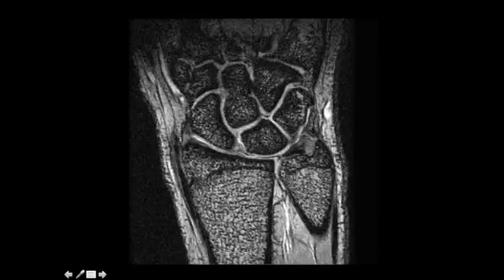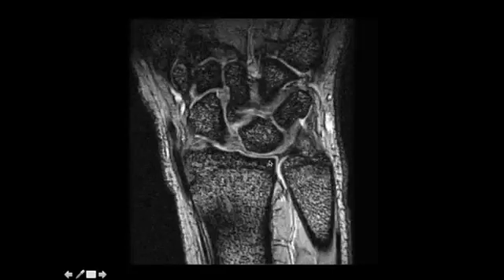As we previously mentioned, we have the distal radial ulnar joint. The distal radial ulnar joint is also covered by articular cartilage both along the ulnar head margin as well as the distal radial margin. And this indentation along the medial aspect of the distal radius at the articular surface of the distal radial ulnar joint is known as the sigmoid notch.